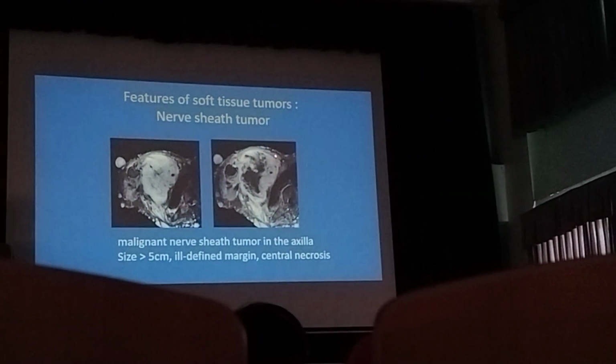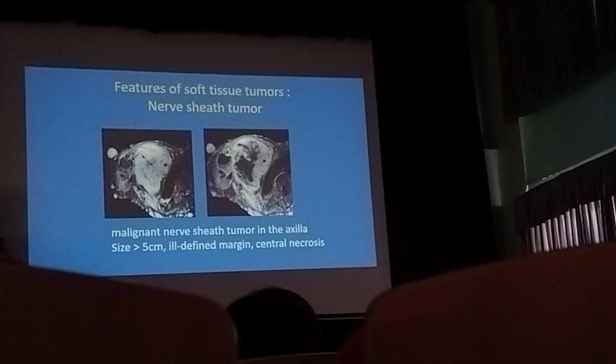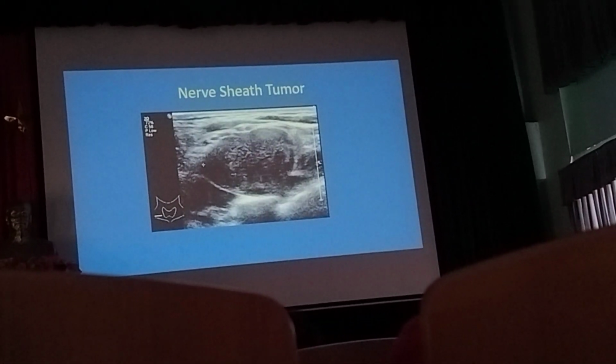Okay, and this show post-contrast enhancement show heterogeneous of the mass. Các cái lớp tuột thấy là tầm tuột không đồng nhất, có cái vùng tuột và cái vùng ngoài tuột. Okay, and I just pass this one.